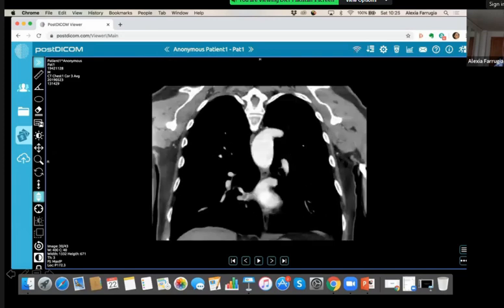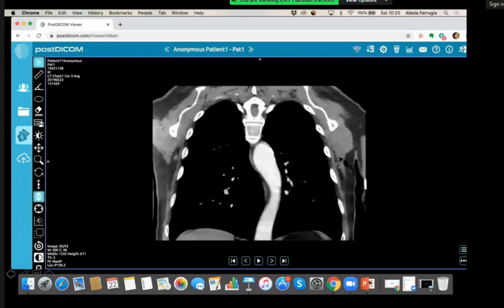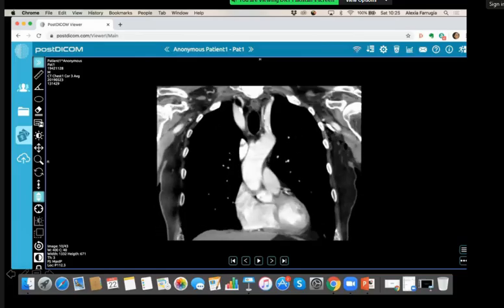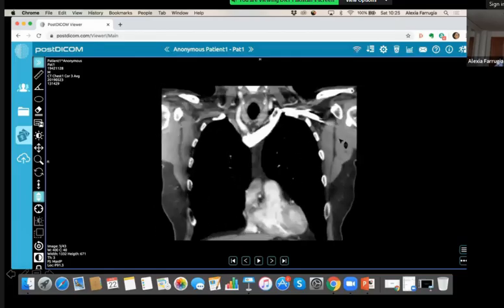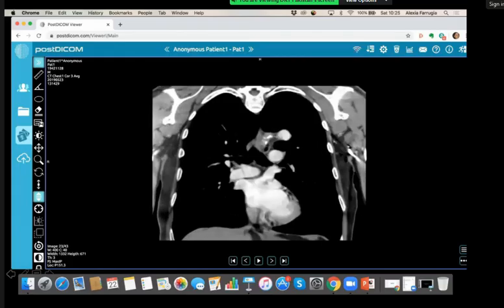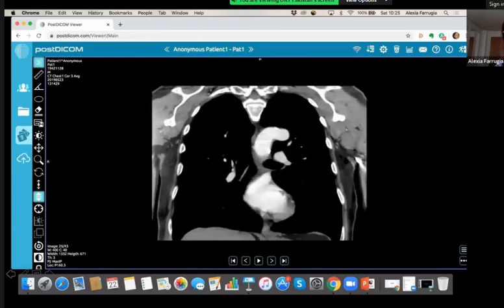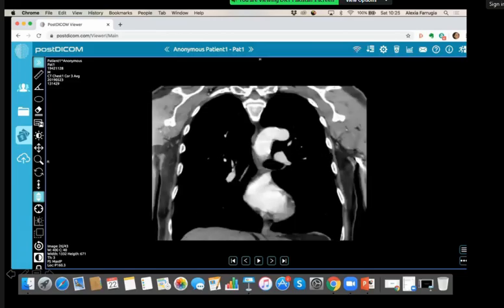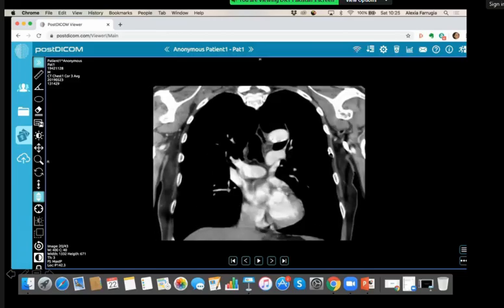So it has an unusual configuration, doesn't it? Yes. It's not aneurysmal. I can't see any penetrating ulcers, dissection flaps, or important negatives. Okay. So I don't think it's acute aortic syndrome. No. Given that the patient is quite an elderly gentleman, it may represent a slightly ectatic aorta.